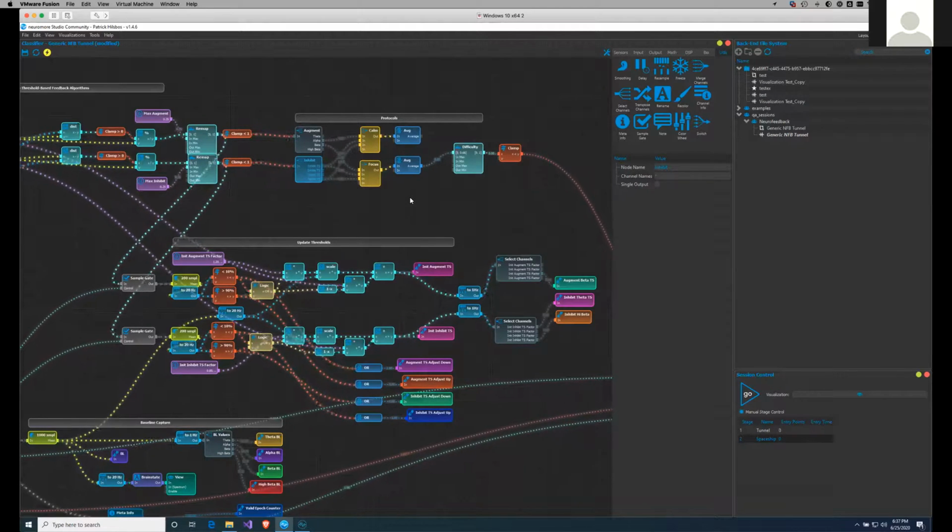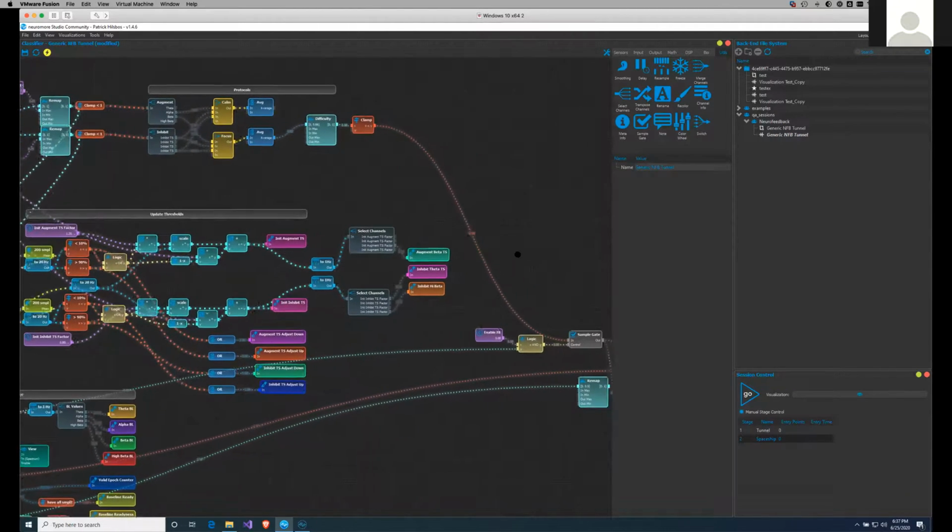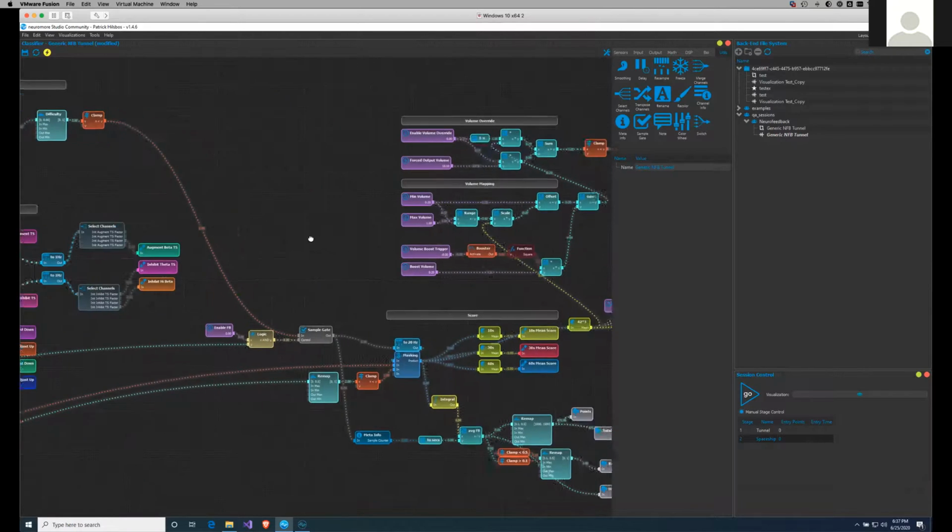But if you're an experienced neurofeedback practitioner, or if you're just an enthusiast and you know how your protocol should look, that's the area where you want to look to inhibit the channels that you want to inhibit, and to augment the channels that you want to augment. And down here, you can determine what kind of baseline you want to take.